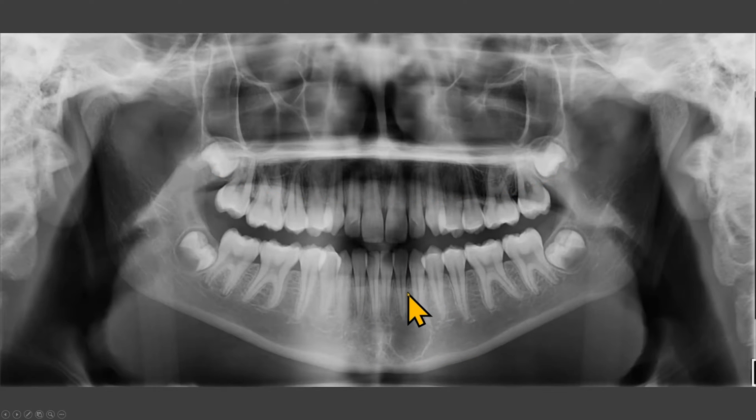You may have a different standard protocol, starting from the right maxillary central incisor to the third molar, then from the left maxillary central incisor to the third molar, then mandibular central incisor to the third molar on the right side and mandibular left central incisor to the third molar. Or you may even have another protocol. Whatever you do, always follow the same protocol. Following a standard protocol regularly is critical for good diagnostic result.